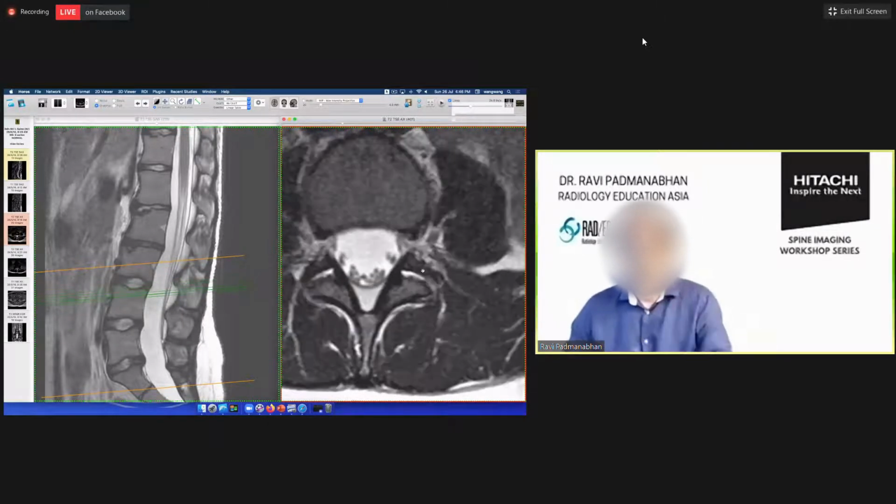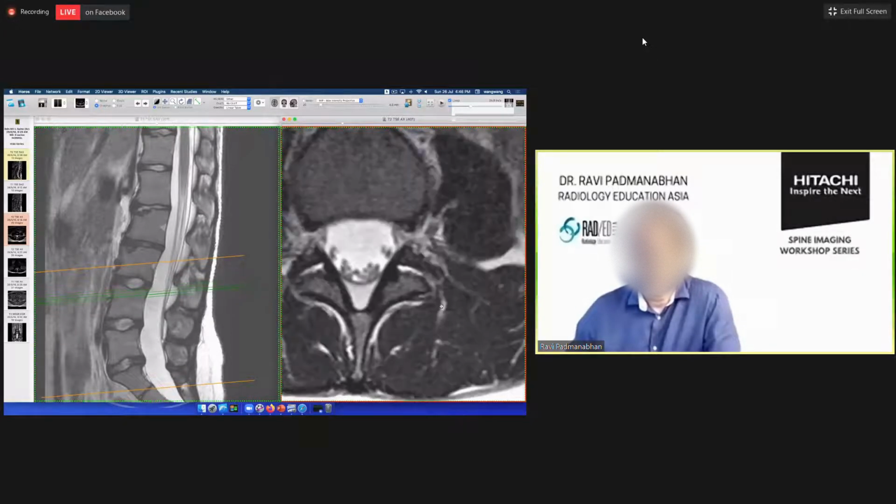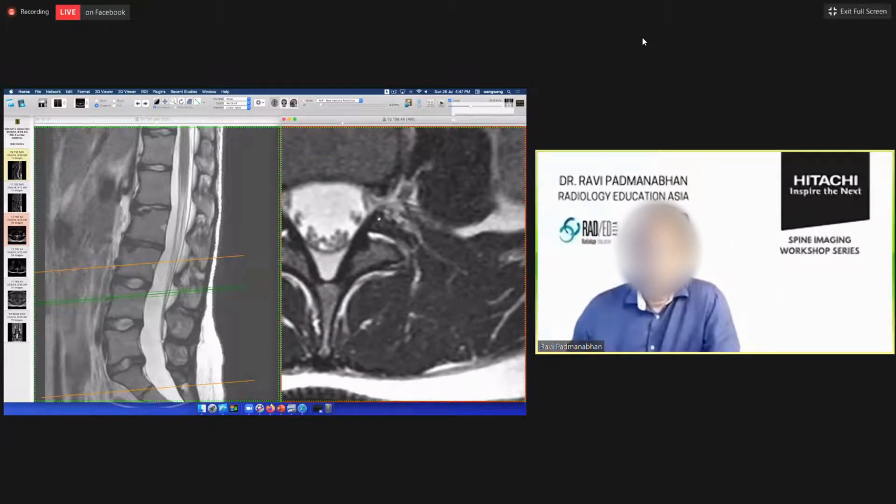We'll come back to this again in a moment, but basically we can have a cyst that sits within the subarticular lateral recess. We can look for cysts within the foramen. We can look for cysts outside here. And the other area which is commonly missed, because we just sort of don't look, not that it's difficult, are posterior paravertebral cysts, which come out of the posterior margin of the joint. And the more important ones are really the ones anteriorly, because they're the ones that can compress nerve roots. Okay, so let's go back now to the slideshow.